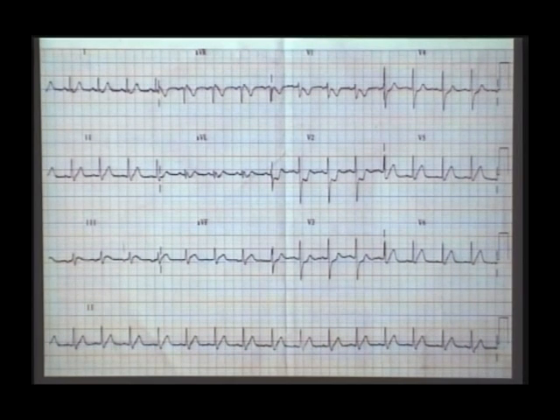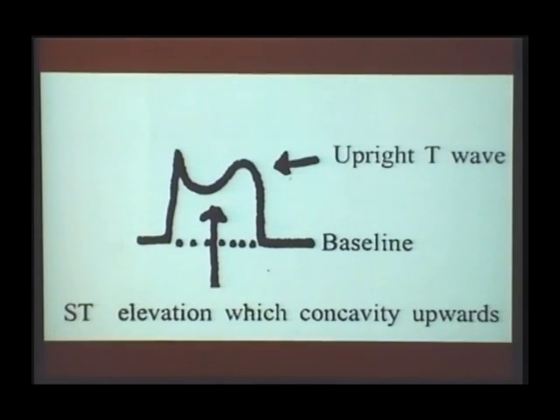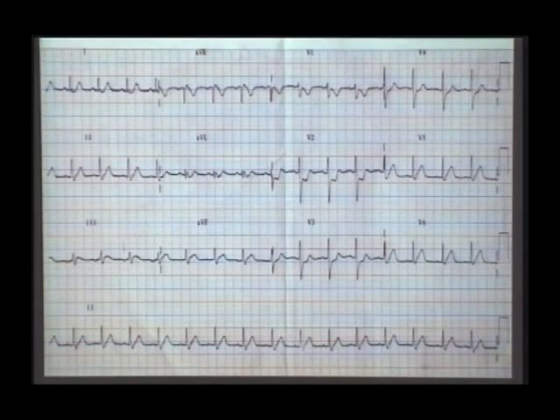Whereas in all acute inferior wall infarctions, where there is ST elevation in the inferior wall, you must also look at V1, V2. For what? ST segment depression. So whenever in the early hyperacute phase ST segment elevation is there in the inferior leads, and V1, V2 show ST segment depression, it tells you what? There is also posterior ST elevation.